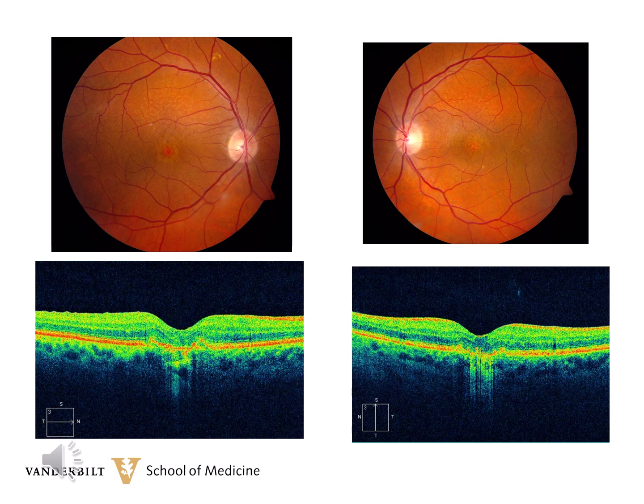Here is the same patient 6 years later. His vision is stable, but you can see that both eyes now have lost the vitelliform appearance and have developed atrophy of the retinal pigment epithelium centrally. The collapse of the vitelliform lesion and the atrophy is demonstrated with the OCT showing the hyperreflective areas in the choroid.